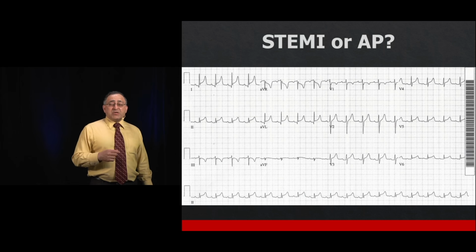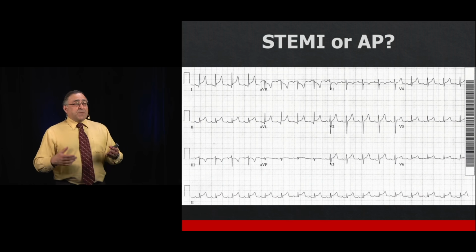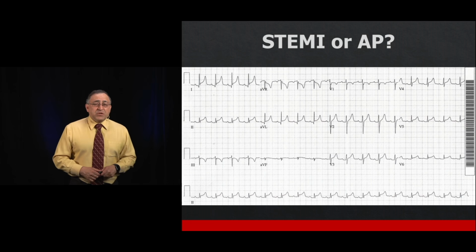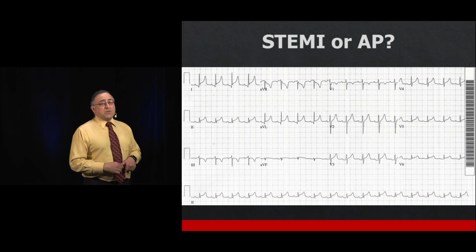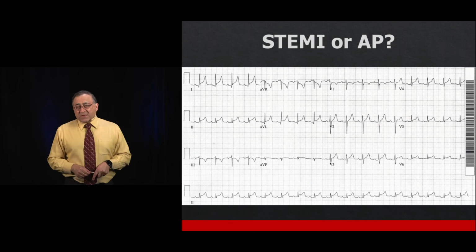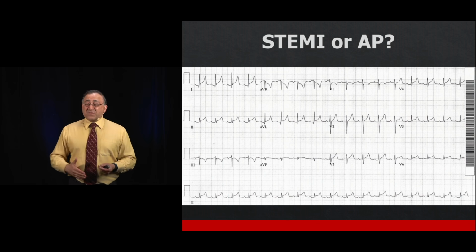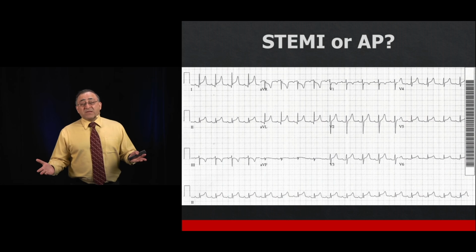The PR depression is gone. This is not typically taught, but PR depression can be very transient. It doesn't last forever. Sometimes it might be there for only a few hours. And if you're not lucky, if this were the only EKG that we got, this would be a really tough diagnosis because we'd go through the whole algorithm that I showed you and not arrive at a diagnosis.